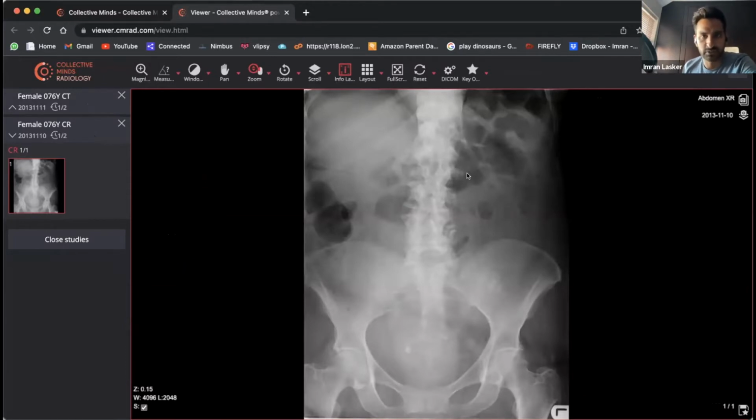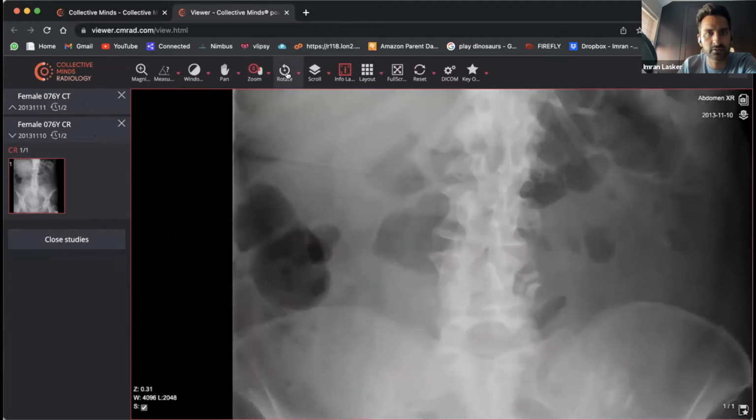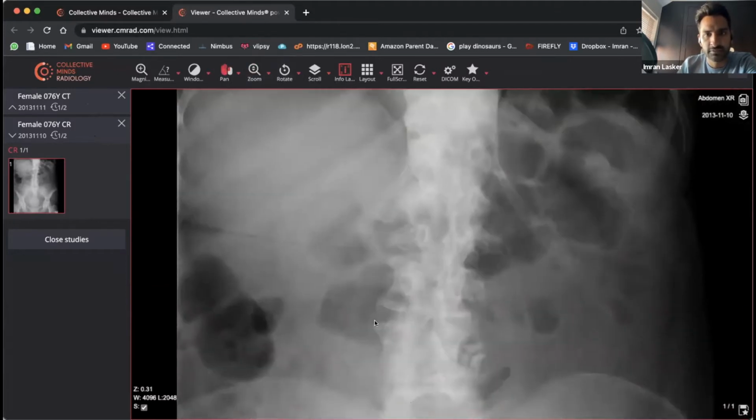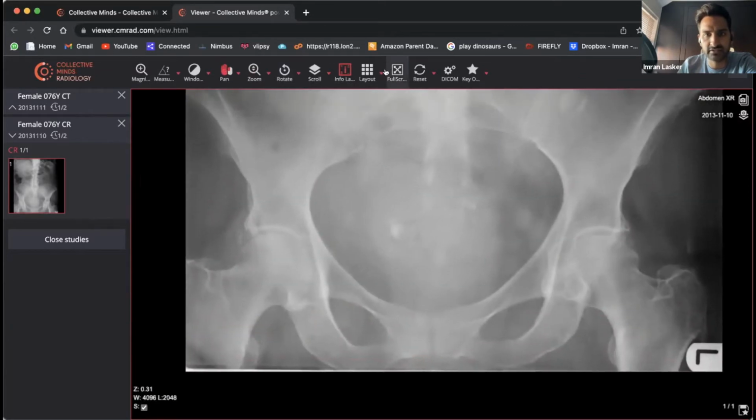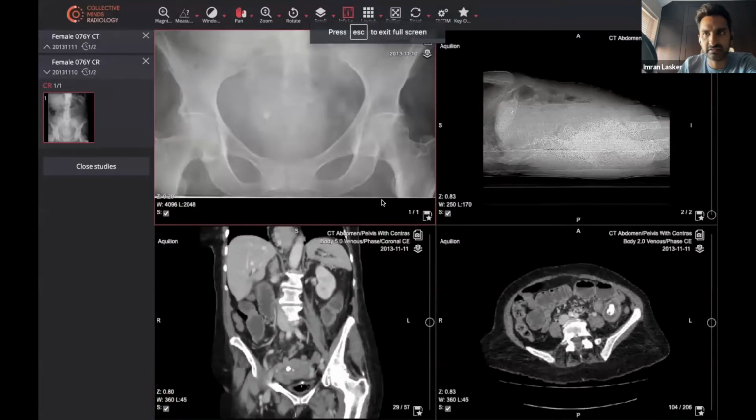They've definitely got abdominal pain, right? So it doesn't feel like there's much going on right at the moment. Let's zoom in a bit, see if there's anything going on. Please feel free to throw in whatever you think may be going on. But bowel-wise, it doesn't look like there's very much dilatation going on. These look like they could be phleboliths, don't they?